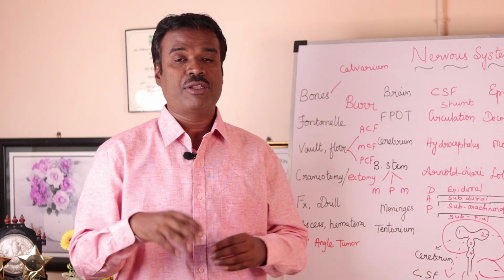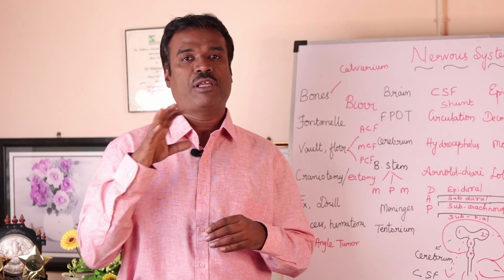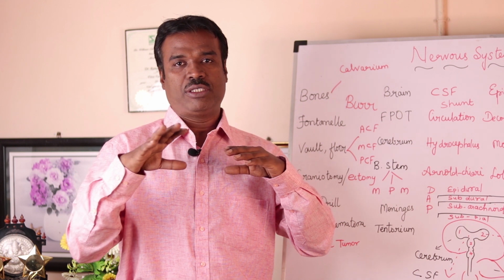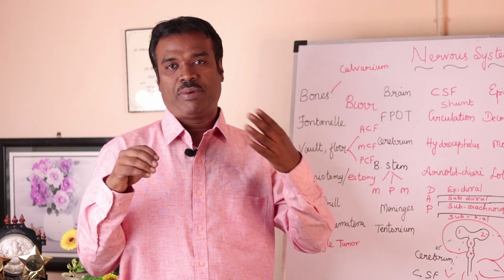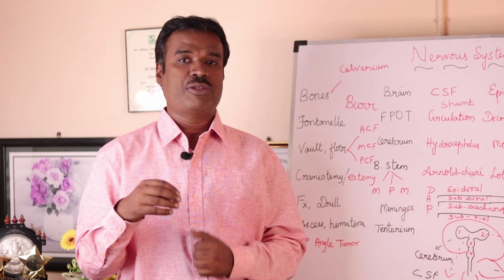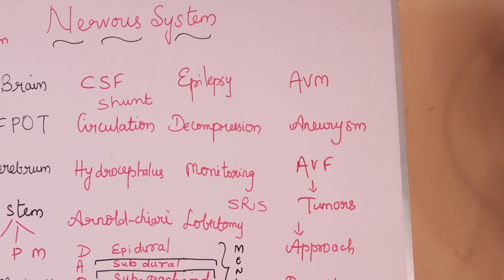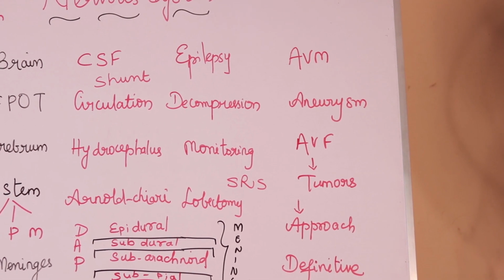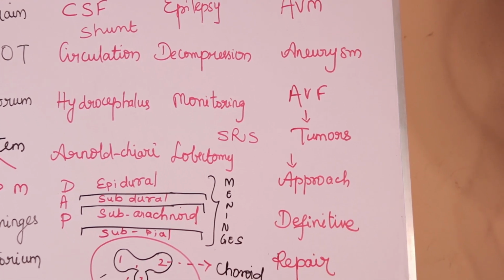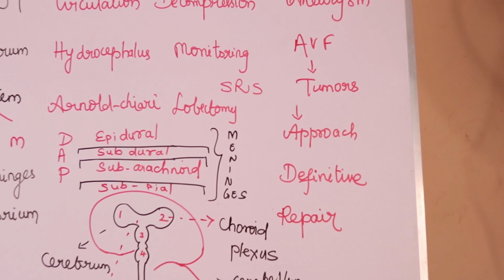In a programmable shunt, the physician places a device subcutaneously, and this allows a kind of threshold pressure. Whenever the threshold pressure is exceeded, a shunting mechanism begins to take place, where the fluid is drained into a body cavity. This reservoir is actually a subcutaneously placed pump, or a device placed within the subcutaneous scalp region, and it measures the pressure changes in the brain.